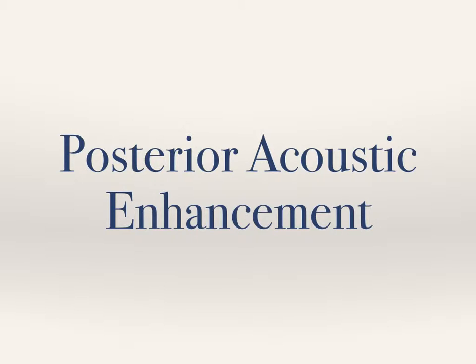Now, this is dependent on what type of material is in the abscess cavity, how old it is, as it could be so thick that there is no posterior acoustic enhancement. Now let's look at an example of it.